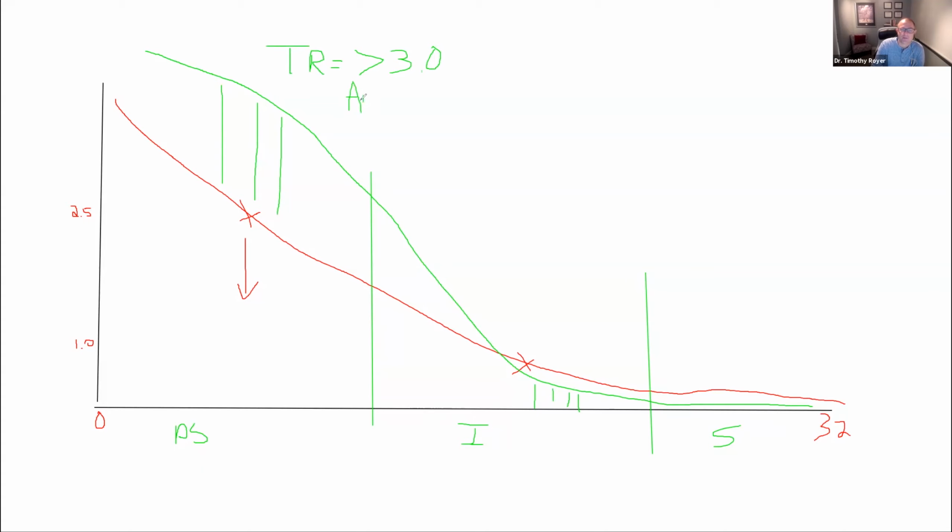So when you see a slope like that, it's not just a matter of filling out a checklist. This tells me that the person's issue is they have too much of these slow waves, and so it makes it very hard for them to focus. And the brain waves that manage impulse control are non-existent, so they become more impulsive. Consequently, if I was to give this brain a stimulant, like an amphetamine, what would that amphetamine do? It would cause some increases down here and some suppression here. And so the person would feel like they're focusing better. But the problem is we haven't solved that problem.